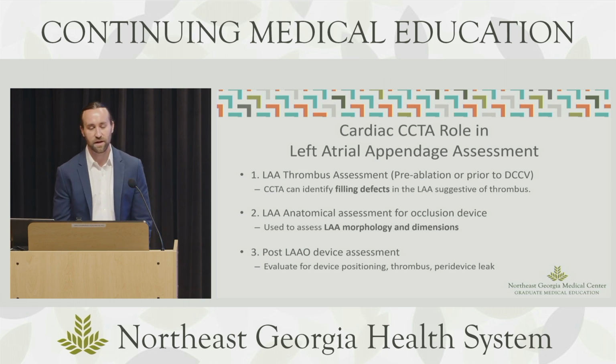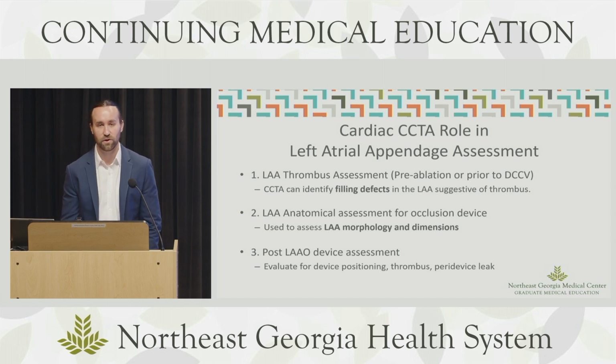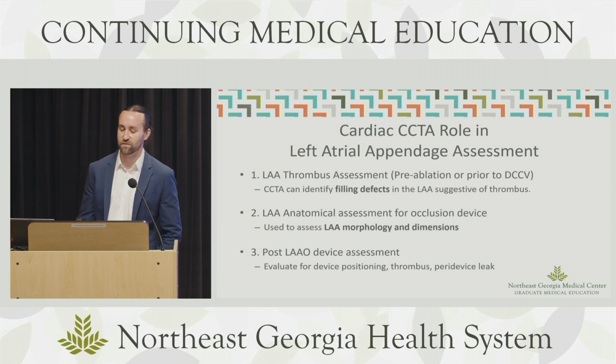The first one is left atrial appendage thrombus assessment. Whether you're going for a pre-ablation or you need a cardioversion for your atrial fibrillation, a CCTA can identify filling defects in the left atrial appendage suggestive of a thrombus. It also can help assess the morphology and dimensions for the occluder device, and after you get some kind of occluder device with a Watchman or Amplatz, it can help you evaluate the device for positioning, thrombus, or peri-device leak.